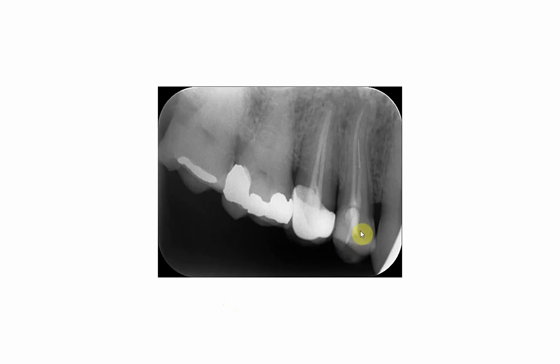Now the upper 4, which is also root canal filled, we will see that there is a composite filling which is used in the coronal part of the tooth, and you can see here that there is a root canal filling, gutta percha, and if you concentrate on the palatal root, you will see that there is a material which has a more radio opacity than the surrounding or the rest of the filling material.